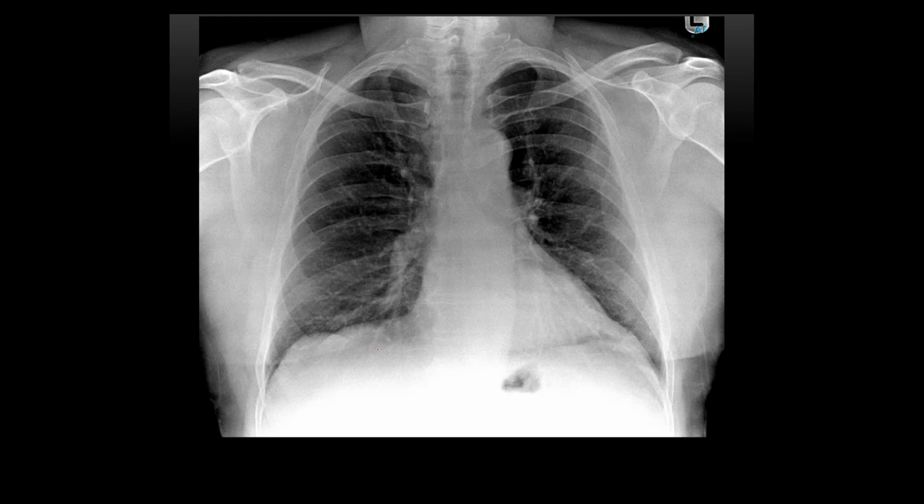No. Are you looking down here? Yeah. I think this is just breast tissue overlying the lower zones. No. Look at the density, they're very, very similar. They're in the normal position, they're a normal size. It is a subtle one, this one.